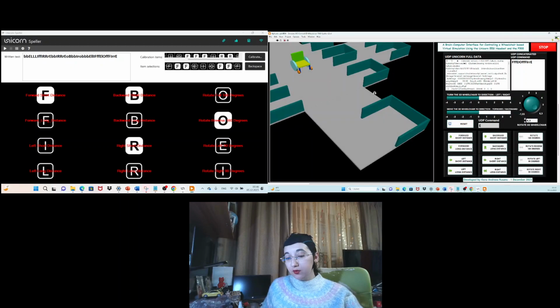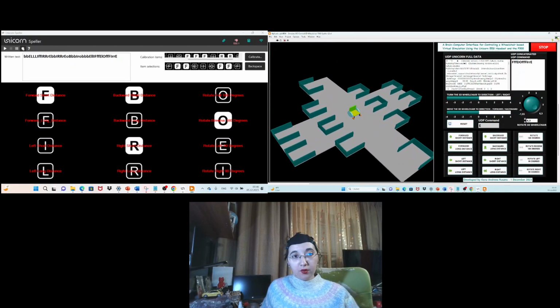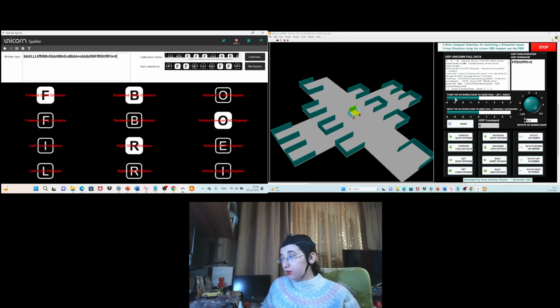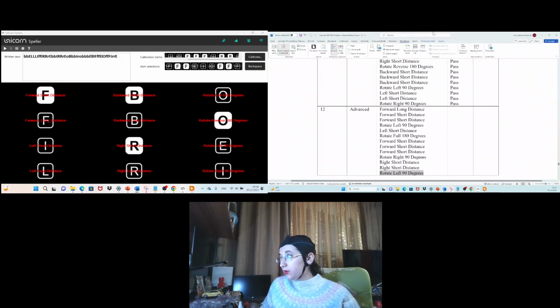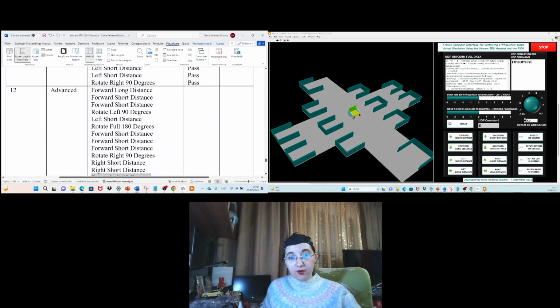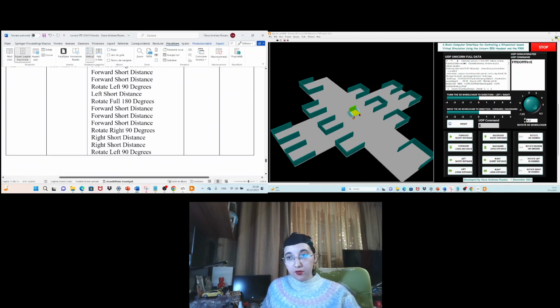Okay, so here is set. So if we go to board and timing, board content, here there are some output text that are sent from Unicorn to LabVIEW. Or in fact I am interested in the names of the files, so maybe that's why there were some missed values. But I want to manually control the 3D wheelchair by considering these movement directions.